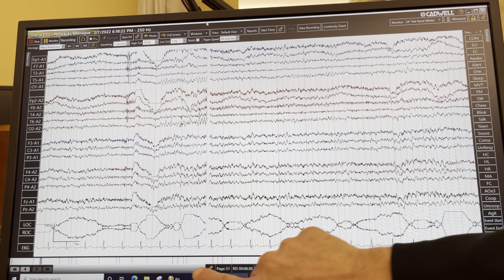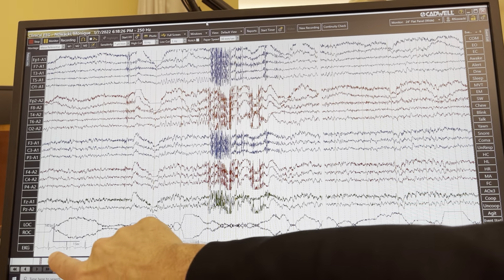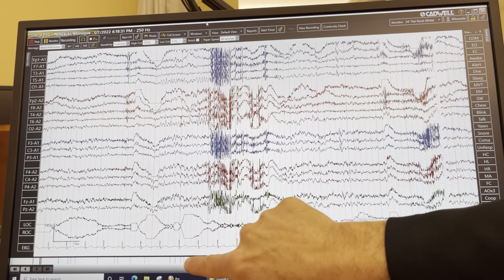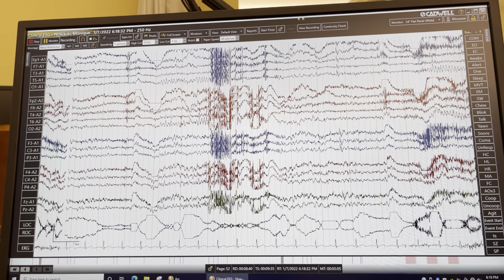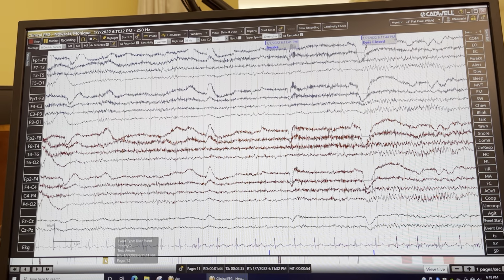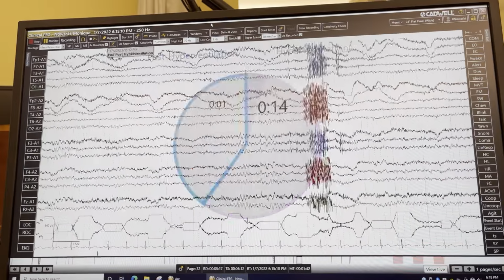Okay, so if you click on this bar down here, that is actually what's recorded, down on the bottom here. So if you click anywhere on there, it'll go into review mode in that part of the test. Okay, you can see the cursor where I clicked right here, and this is what we recorded earlier in some of the annotates, but you can scroll by using the right arrow.